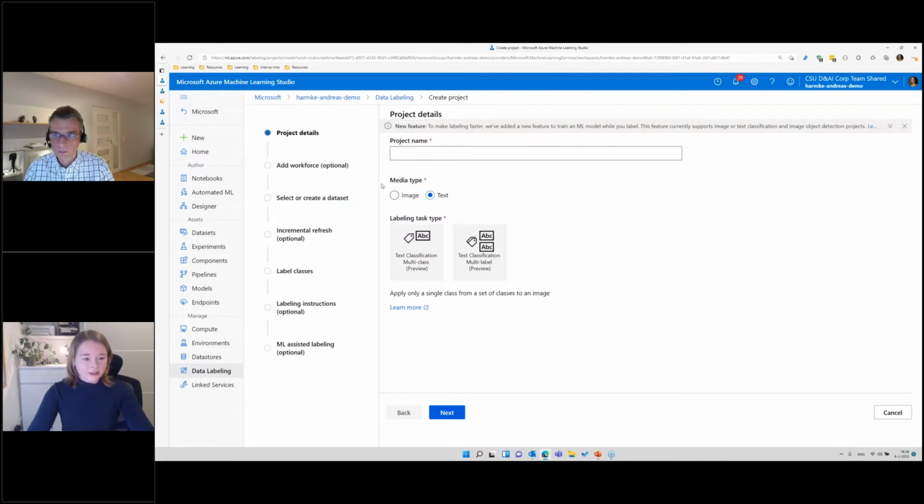Some other interesting options that you have here is to add an external workforce. So in this case, there's an actual external workforce from a different company being added for scalability purposes to give labels to your data. And here is also the location where the project manager can enter the labels and also the instructions for the labelers. And here you can basically enter if you want to have this ML assisted labeling, where these pre-labeled tasks will appear after labeling some of these data manually.